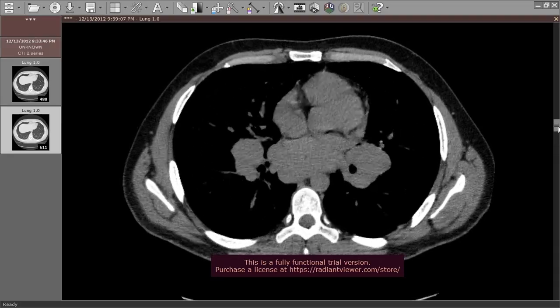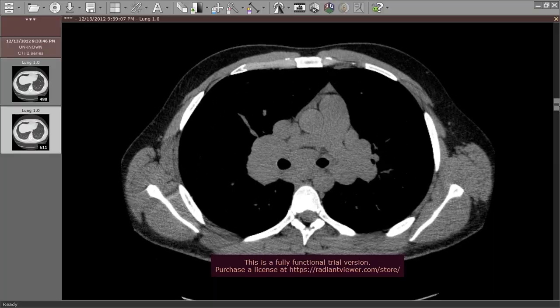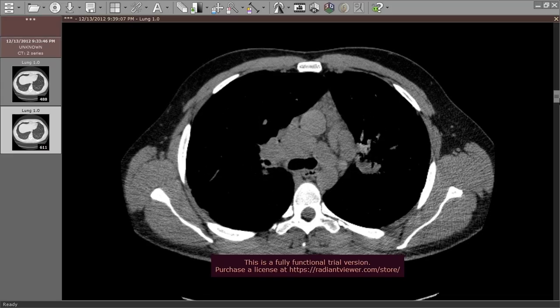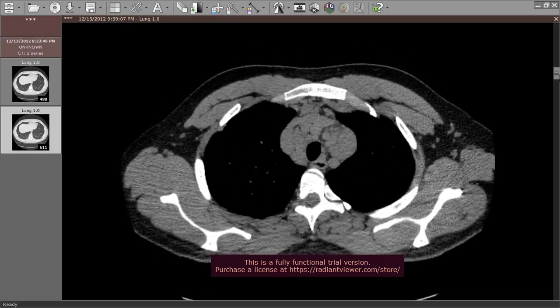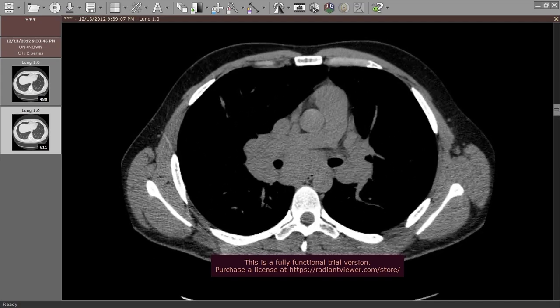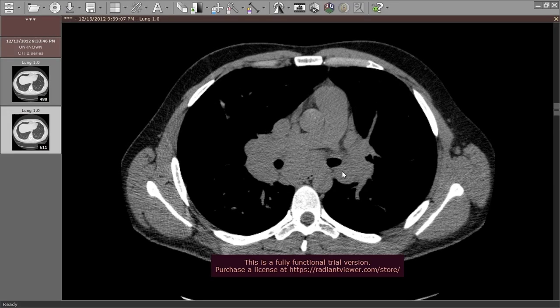What can help to differentiate actually? What can help to differentiate first of all is the age and sex of the patient. If she is female in young age or middle age, we have to suspect sarcoid. If we have more predilection for the hilar region rather than the mediastinal region or generalized lymphadenopathy, it will favor sarcoid.